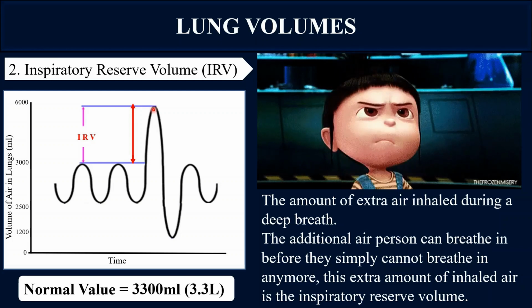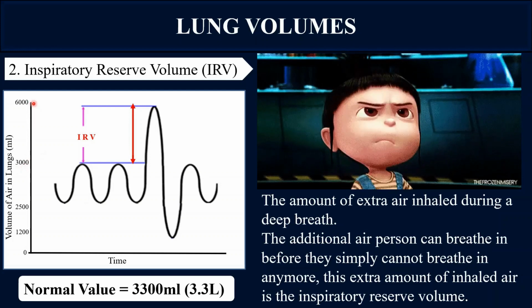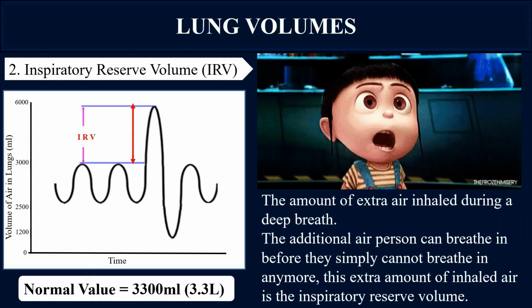So what is the measurement of the inspiratory reserve volume? As you can see there, this is 3000 and this is 6000. So the normal value of the inspiratory reserve volume is 3300 milliliters.